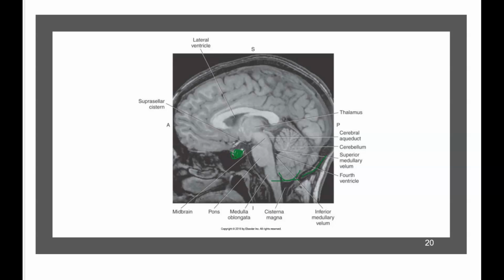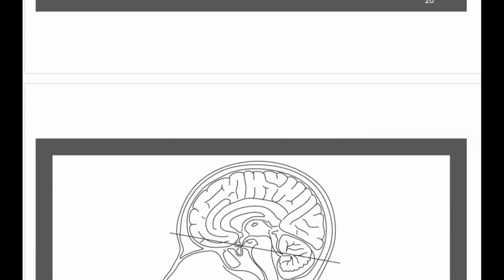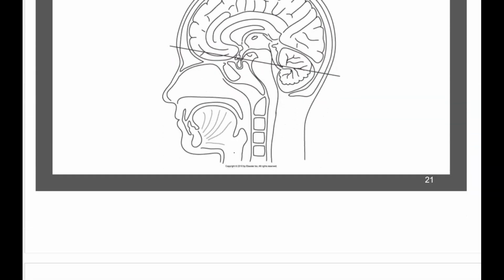A lot of patients will come in for MRI and they have sudden onset of blurry vision. So we're like, okay, sudden onset of blurry vision, glasses don't fix it, nothing fixes it. And what it is, typically, is a pituitary adenoma. A tumor growing here comes up and pushes on this optic chiasm, and it gives them blurry vision. So we do a lot of scans of pituitary adenomas for this reason. Very common.